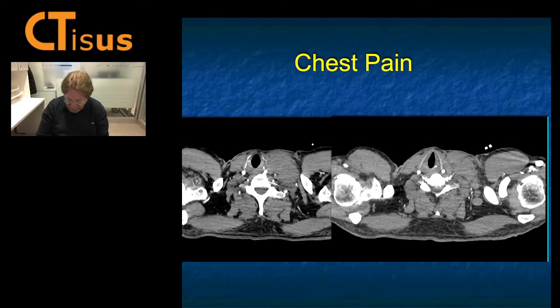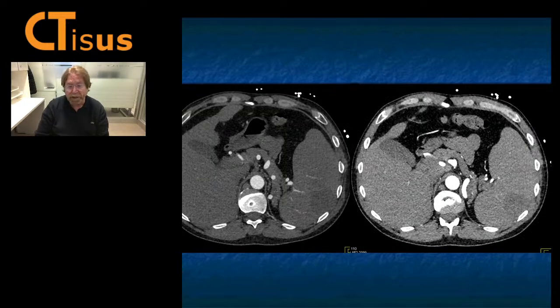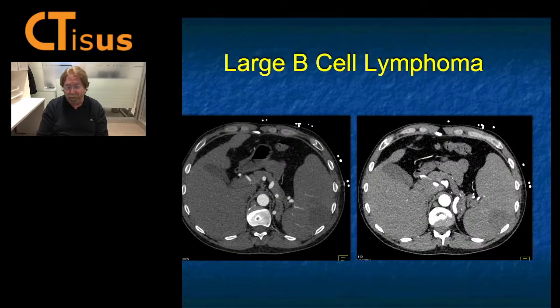Now, I put this case in. It's just a simple case. Patient with palpable mass in the neck and chest pain. Well, the mass in the neck, you could think about nodes. Maybe the patient has a head and neck cancer. Maybe it's lymphoma. Maybe it's esophageal or gastric, and the nodes drain up that way. That's a possibility. And then I showed you 2 scans in the abdomen. There's a mass in the spleen, and the spleen is enlarged, and there's nodes near the porta hepatis. So now you say, what gives you a mass in the neck, lesion in the spleen, nodes in the porta? Put it all together. What you're dealing with is an acute presentation of a patient with B-cell lymphoma.